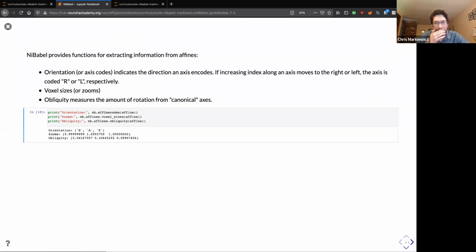I'm not sure I have the best images for it, but the voxel coordinates are just what index in the voxel array it is. It's purely a way of talking about where I am in a block of memory, which has no anatomical meaning.